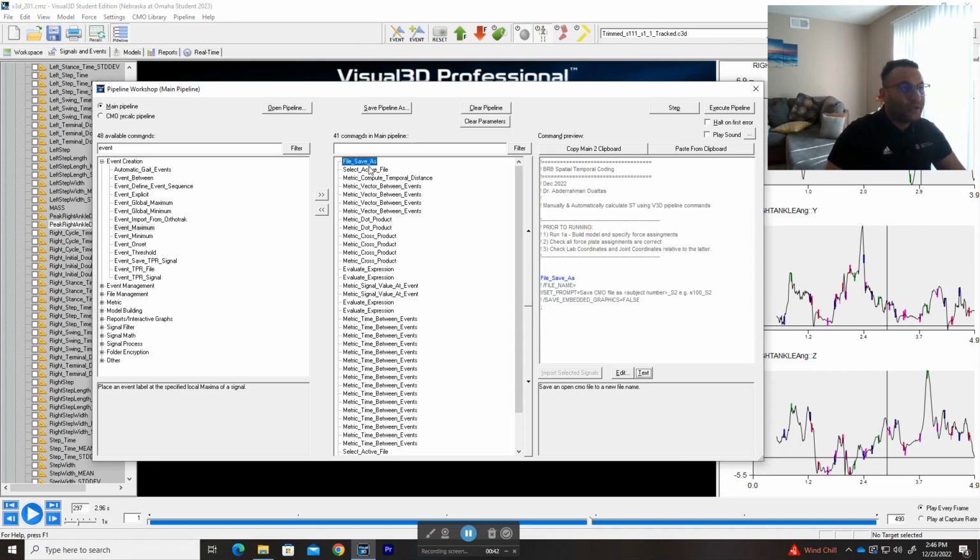It's always better to do it that way to make sure you consolidate those memories and you practice it yourself, so you feel accomplished as well. All right. Again, first start with File, Save As. So here we'll focus on creating spatial temporal outcome measures, both manually and automatically.